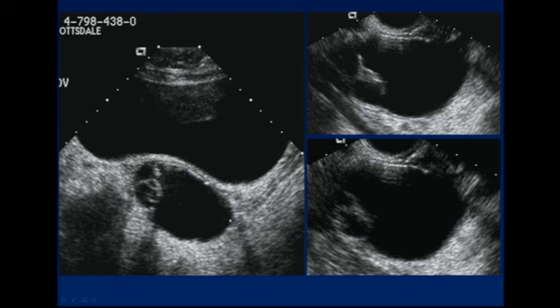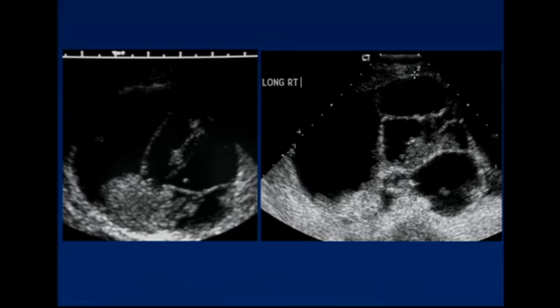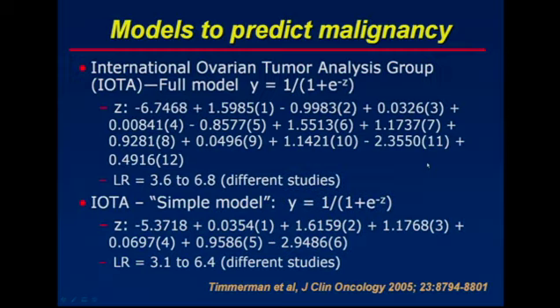When we encounter a mass like this, a multilocular cystic mass with septations, albeit rather uniform and thin, we need to think about a neoplasm. And especially in the setting where there are septal nodules and wall nodules. Clearly here on these two different examples, this has to be viewed with a very high suspicion for malignancy.